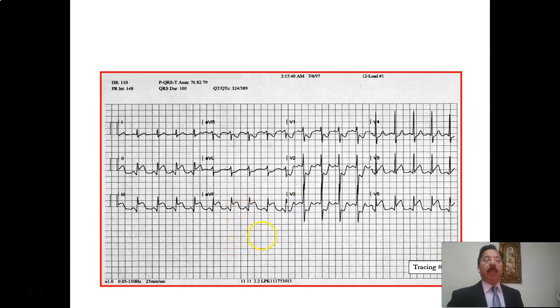Look at this ECG. Is there any ST segment elevation? So the answer is yes. It's in 2, 3 and AVF. So this is your inferior wall myocardial infarction and lateral as well, if you look at V5 and V6. So infralateral myocardial infarction. And you see V2, V3 and AVL, these are the ST segment depressions. These are reciprocal changes.